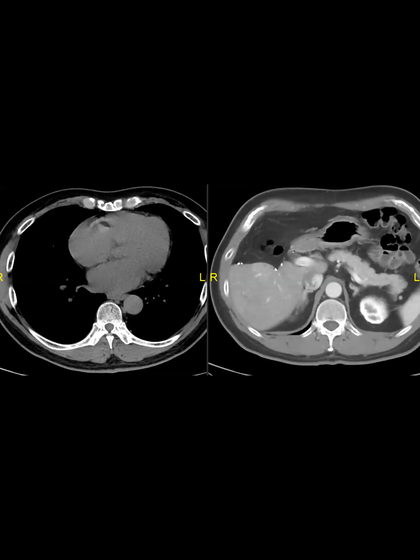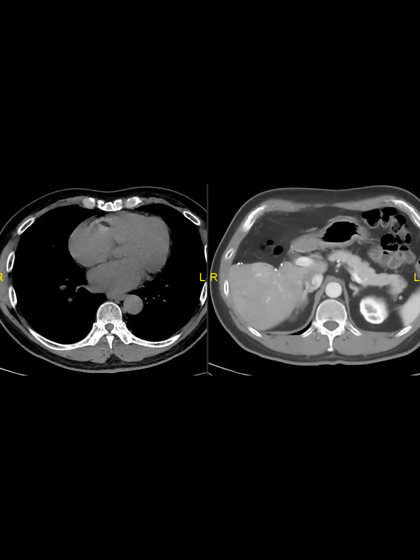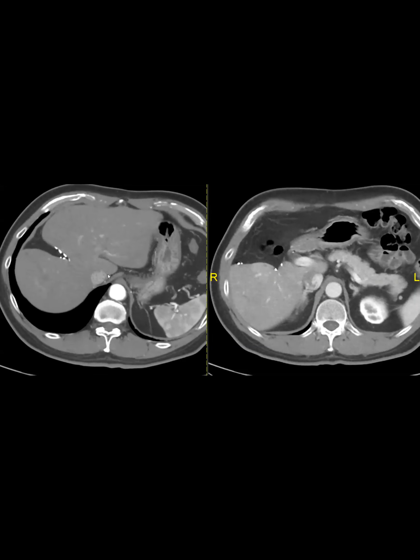So this is a patient who has a history of HCC. You can see that it was removed. Hepatocellular carcinoma, my favorite cancer. Of course, there's a history of HCC. So this is a CT from about 8 months ago. This patient's original HCC was 5 or 6 years ago, and she was followed and is doing great. So this is the prior.